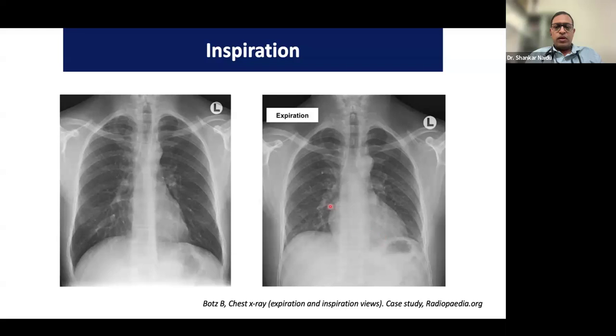And also you can make out the heart shadow as well, where you can see in the expiratory film it appears to be slightly enlarged compared to the deep inspiration.